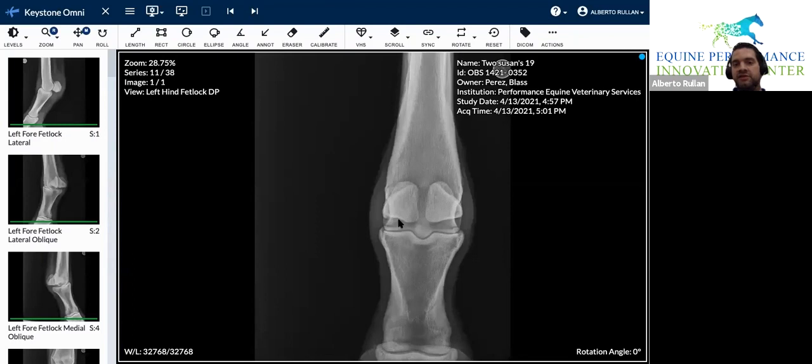This is the condyle. This is the medial condyle. How do I know it's the medial condyle? Because the marker right here is always on the outside. So in this case, this marker is a dime. Medial condyle, sagittal ridge, where you're sometimes going to see demineralization of the sagittal ridge. Then over here is going to be the lateral condyle. You have the epicondyle, where the collateral ligaments are coursing through, so an important site of enthesiopathies. Then you're going to go up, all the way up.